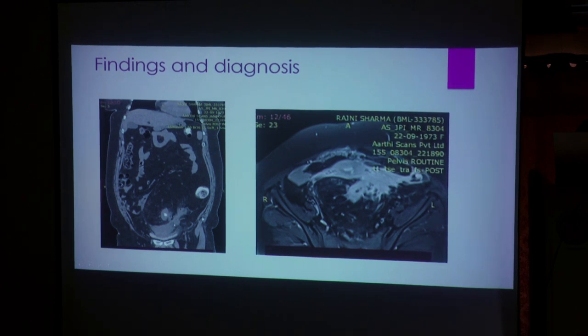So this is Crohn's. Isolated large bowel involvement can occur in about 30% of cases. Without small bowel, only large bowel can be involved in Crohn's disease. So this is Crohn's disease, with varying stages of Crohn's. This will be a penetrating stage with ulcers, sinuses, mesenteric abscess. So this is an inflammatory mass. This patient also had a fistula to the bladder.